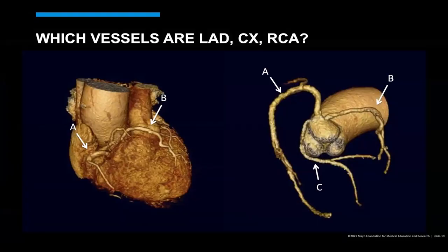Okay, so here's the next case, somebody who presented with chest pain. Which vessels are the LAD, circumflex, and RCA?